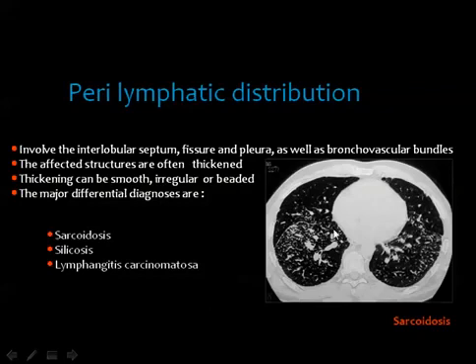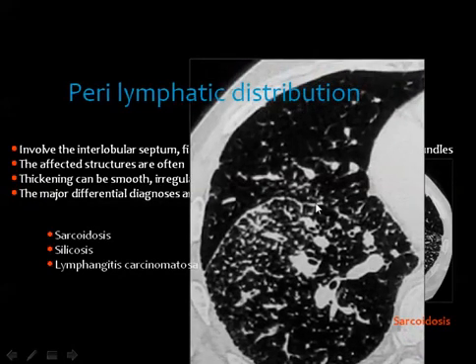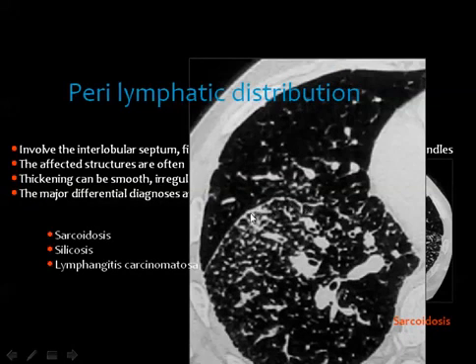Okay, can you see the fissure? Then this is the fissure. If you see nodules distributed along the fissure on one side or on both sides, if you see nodules along the pleural surface, yes, this is lymphatic distribution. On top of the lymphatic distribution is sarcoid. The first possibility is sarcoid. Then you get lymphangitis carcinomatosa if the patient had a known primary malignancy, and you can diagnose pneumoconiosis if you have other features of pneumoconiosis, which I will mention now.